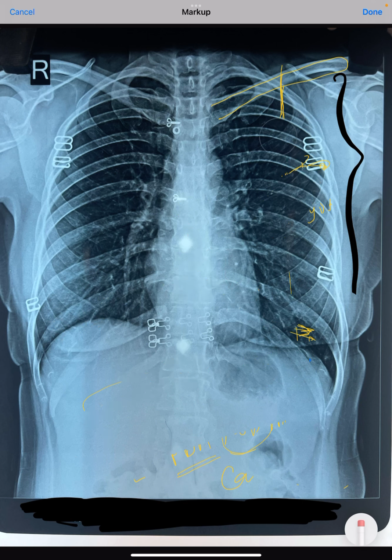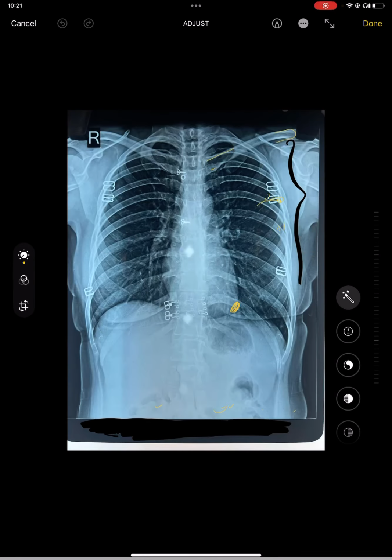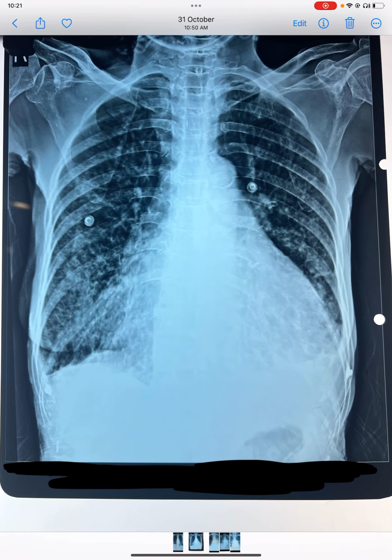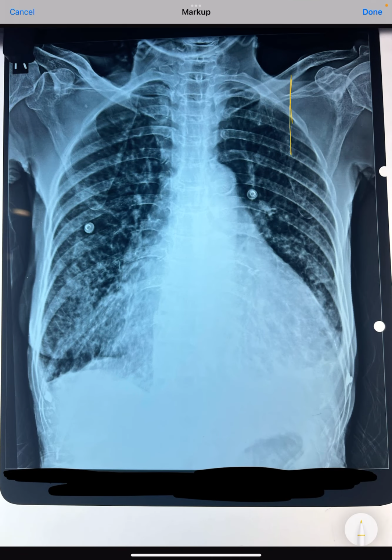So with this knowledge we can see other things. You have to always look for the apex, and you have to find out where the apex is. Now when we go to the other X-rays, in C, this is the second X-ray. We can very clearly see this is the midclavicular region, and see the apex. This is LV and the apex is going here. It is pretty down and out, going outside the midclavicular line. So this patient is very likely to have MR or AR or PDA or VSD or ASD.